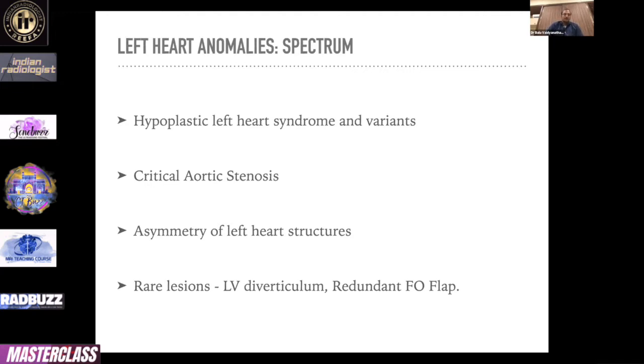And then there are a couple of rare conditions, of which I will show a picture of the diverticulum. And then there is this new thing which is being described, the redundant foramen ovale flap, and why it is important. We had a recent case, and I'll just show that.